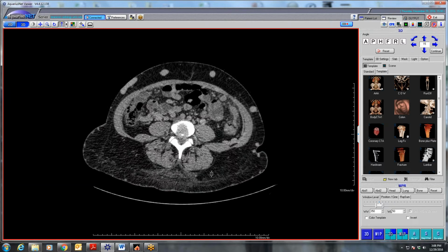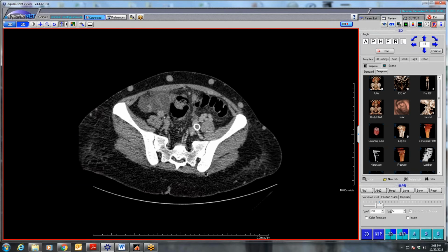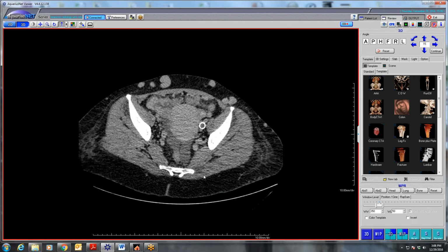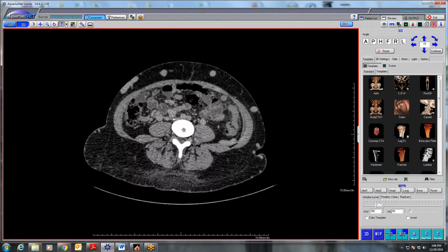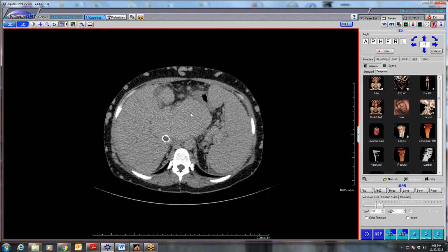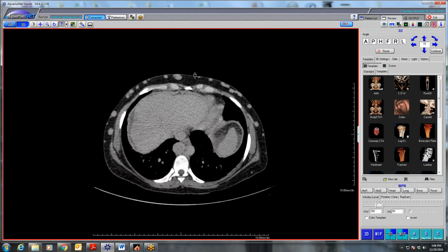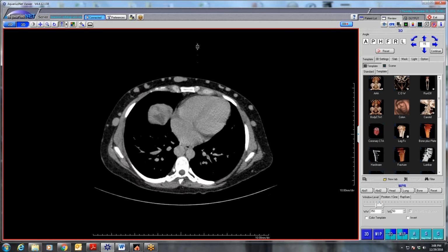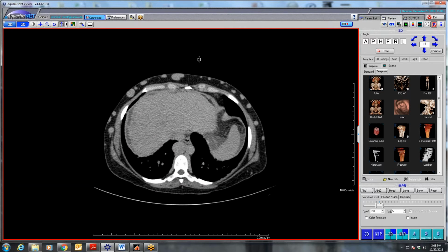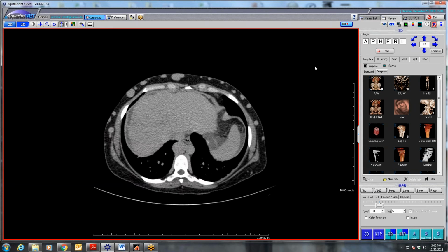We are assuming it's worsening thrombosis due to the initial insult, which was absence of this intrahepatic portion of the IVC. But we could be wrong. We were looking at this for a while. If any of you have other ideas, it's completely possible. We were just saying we hope that no one nicks her skin. It's pretty amazing, these huge vessels.